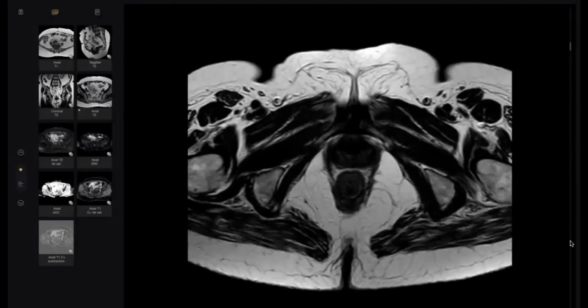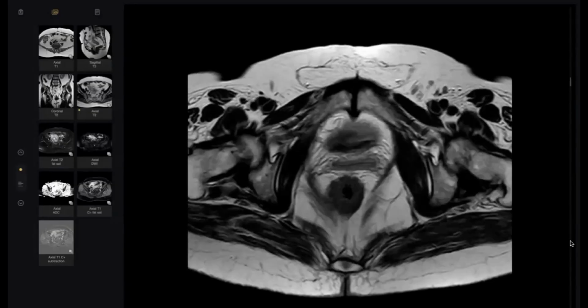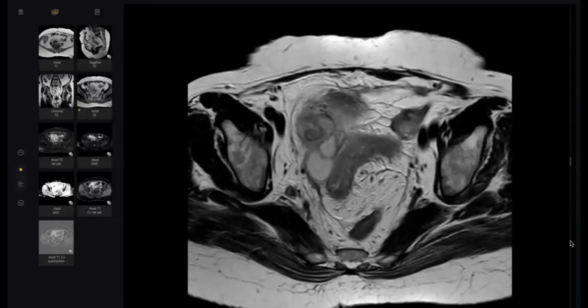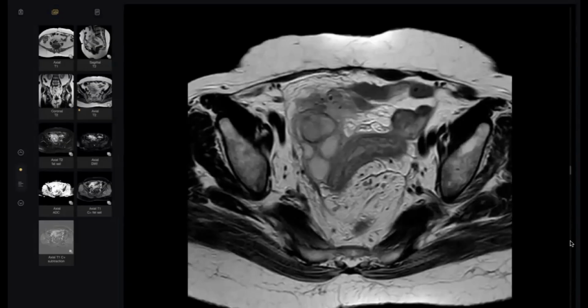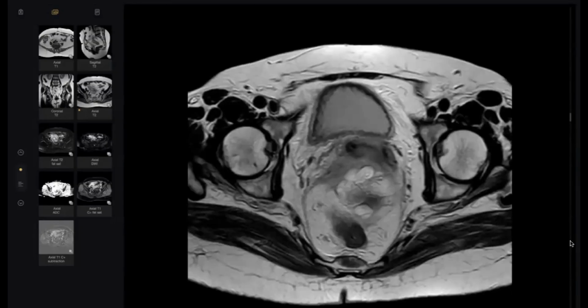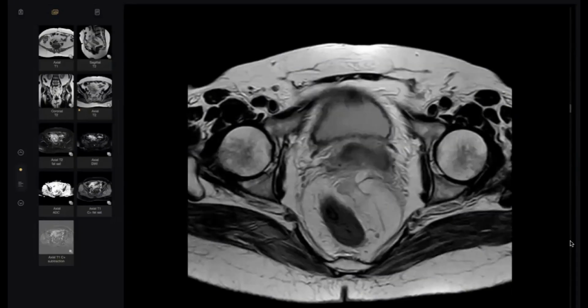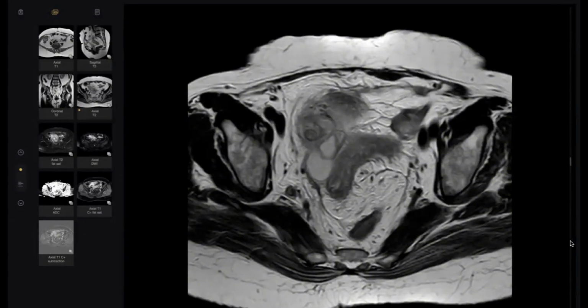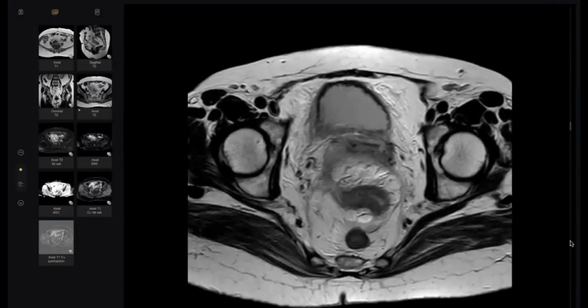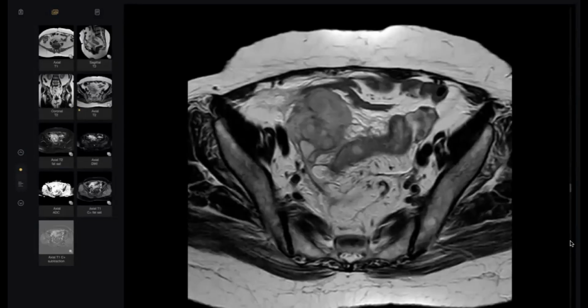I think only the pelvis MRI is included. So I see that this abnormality is arising from the most distal large gut, involving the sigmoid colon in a continuous fashion. This includes thickening of the sigmoid colon and pericolonic fat stranding.